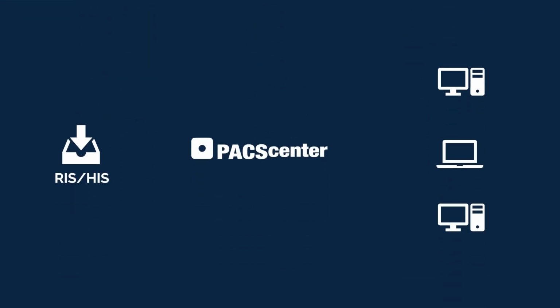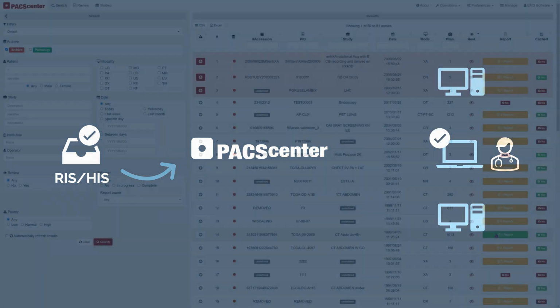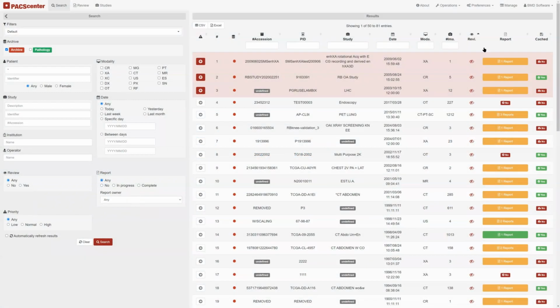First, the Radiology Information System requests PACScenter to prefetch, and then the files are automatically moved to the computers. In this way, when someone appears to work, the studies will open more quickly. It's also possible to use the manual option.